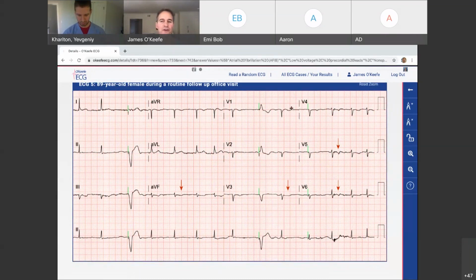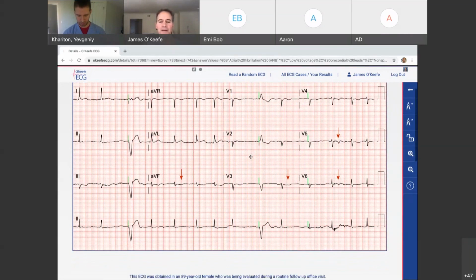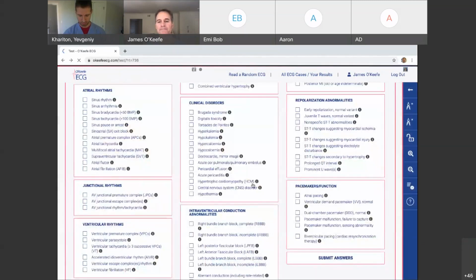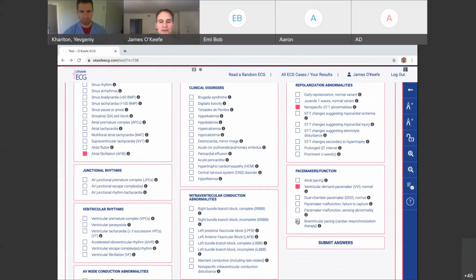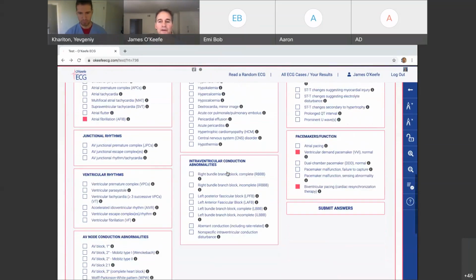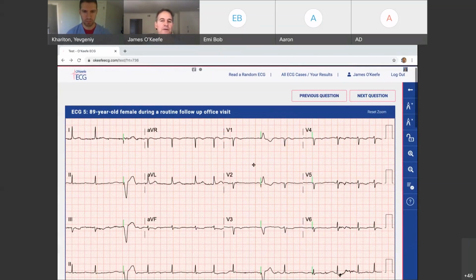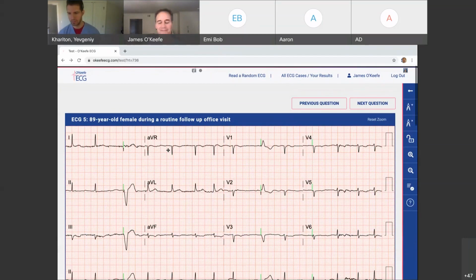And the pseudo fusion is out there, but you wouldn't expect it there. It's a really important point. There is a biventricular cardiac resynchronization therapy, and that's how we make that diagnosis. We look at that. So I think I'll have to add that to the answers because you're right. That should be a big left bundle because it paces from the RV apex, so it goes from the anterior wall back until you get these big left bundle looking patterns with normal RV apical pacing. And when you see that positive thing up there, that's usually CRT pacing. Very good.